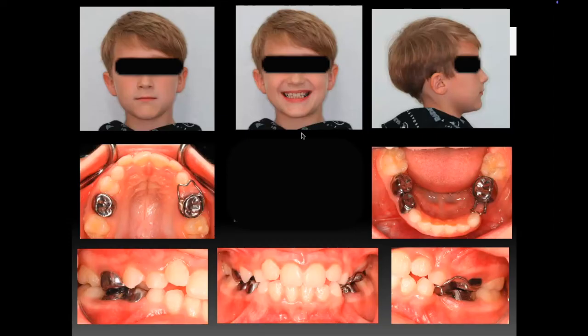All right, let's stick with the maxillary occlusal view. Go ahead and give me your assessment of the crowding and how you're determining that. If you had to put a millimeter number of crowding on this case, how many millimeters would you put on it and why? On the upper occlusal. Me specifically? Yeah, you specifically. We'll give you a shot at it first. Probably 2 to 4 millimeters. All right, so walk us through how you're making that determination.